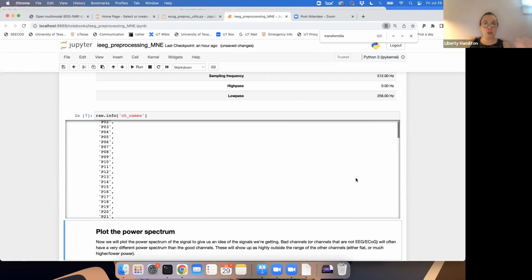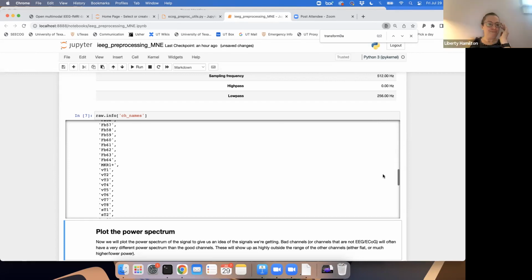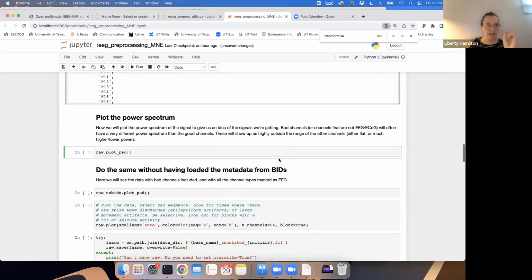Of course, you can look at the sort of screenshots of how they're plotted on the brain. And there are, at least in my group, some of these have names that are related to where the electrode enters the brain and where it exits. And so there are efforts within the clinical community to try and standardize this, but this is also still not standard. So, okay, so let's first look at the power spectrum for these recordings.